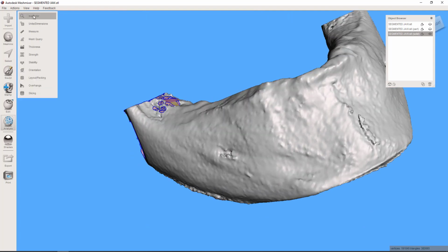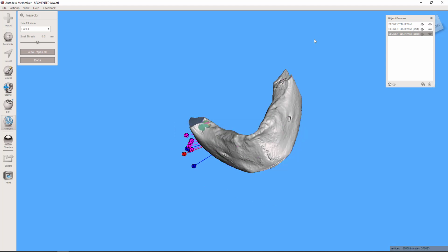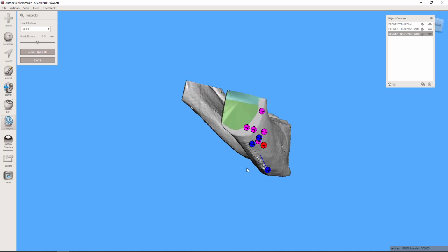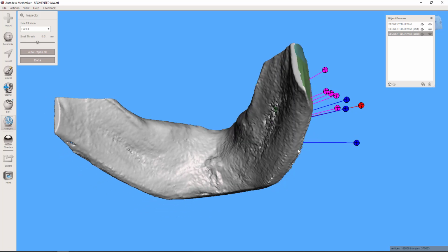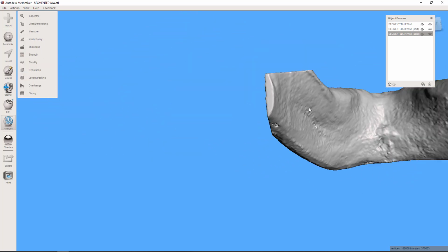So analysis, inspector, tons of errors obviously. Remember, a lot of those are because we've disrupted that mesh, what it thought was solid, by opening up all of these new holes. So now there's all these little bits of triangles just floating up inside of this STL, and it's getting rid of those. Okay. Now it was clearly unable to fix some of it, because remember, the inside of this is all of that, you know, mangled up bits of triangles. It just can't repair it. It can't find a way to close that up adequately.